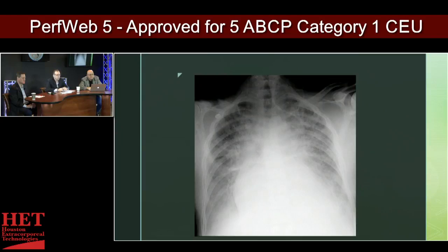What do you think is going on with this picture? Oh my God, I know what that is. Anesthesia gave too much fluid. This is definitely anesthesia's fault.